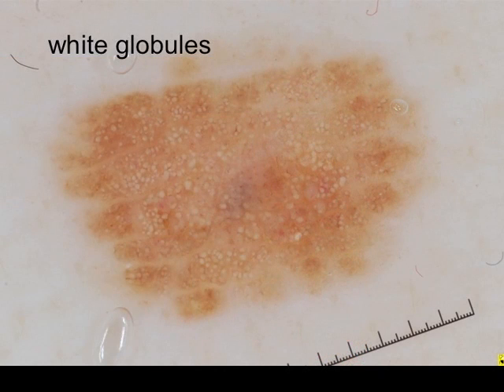And then there is this entity known as white globules. And so here's a nevus with all these white structures. If these were brown, you would actually say, oh, that's easy. That's just a congenital nevus with brown globules throughout. But now you have all white. So you think, well, what are these white structures? So initially we were thinking, are these sebaceous glands? Are these milia cyst? But none of that really fit.